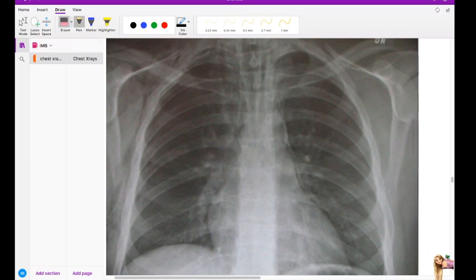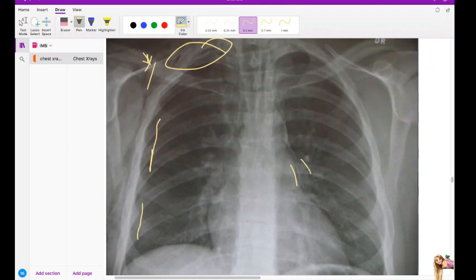This is actually also a pneumothorax over here, I think. I'm forgetting where it was. This is the pneumothorax. Can you guys see this is the translucent line? And also they say that there's a rib fracture. I don't think I see that rib somewhere over here probably. But what I wanted to show is subcutaneous emphysema and mediastinum. And it looks like a pneumothorax over here.